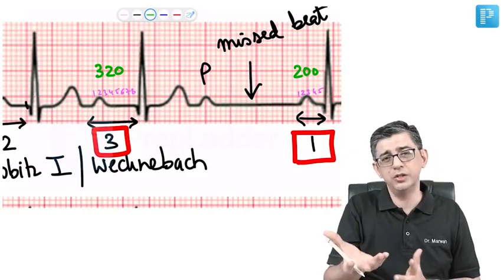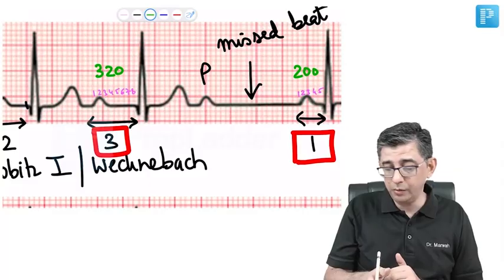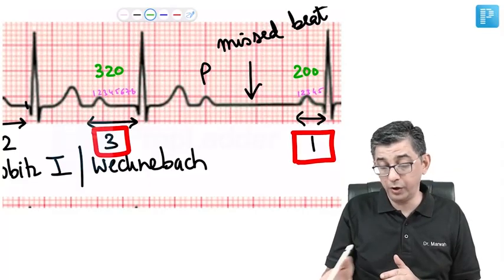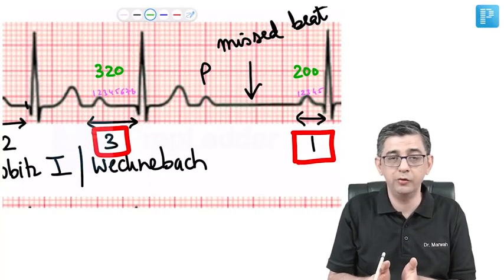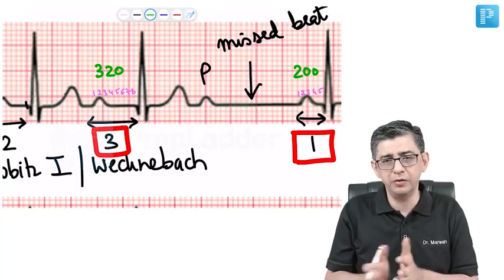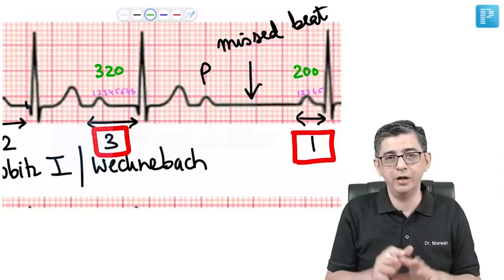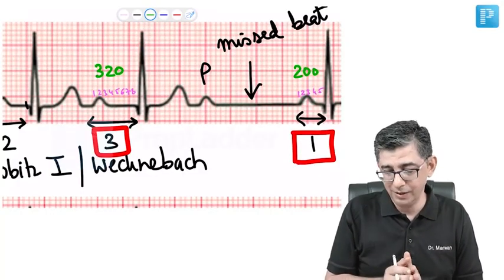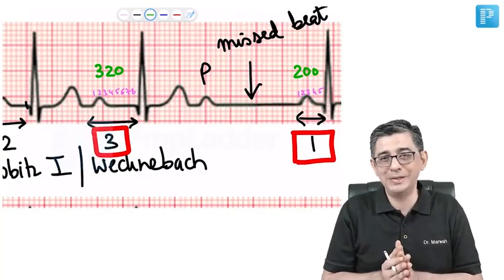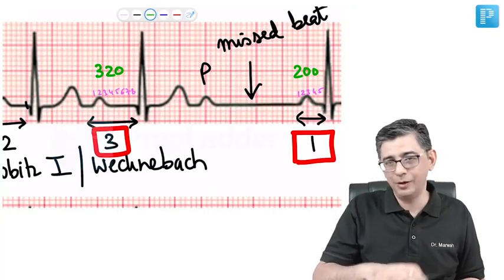Every small square in the ECG is 40 milliseconds. So look at the disparity: 320 milliseconds versus 200 milliseconds. Upper limit of normal versus almost, I would say, a 50 to 60% jump. Mathematically I'm bad, so 200 incremented to 320, whatever the mathematical value, it's definitely an increase. It's not mathematically a 100% increase, because 100% increase would mean 400. But there's a mathematical jump here.